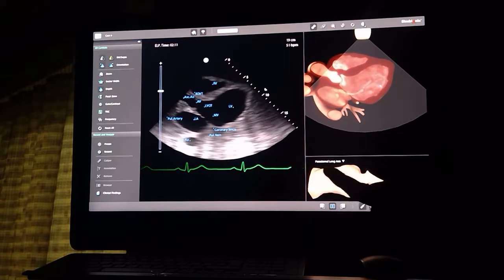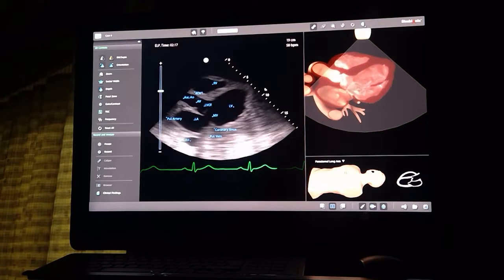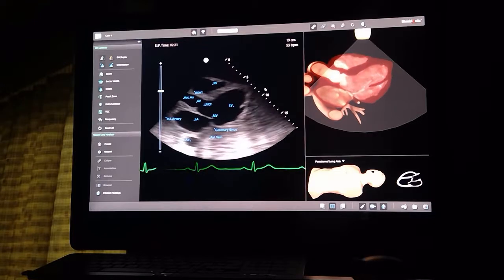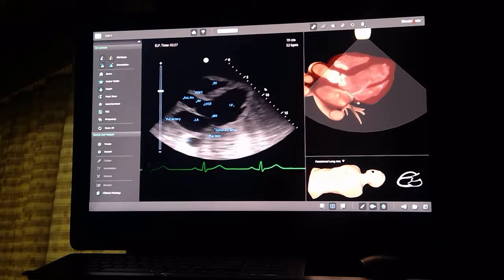2, right ventricle pressures, right atrial pressures are high. IVC is dilated, so that tells you that there's fluid overload, and that fluid overload has led to pressure overload. And this all will tell you that the patient is in acute on chronic congestive heart failure.